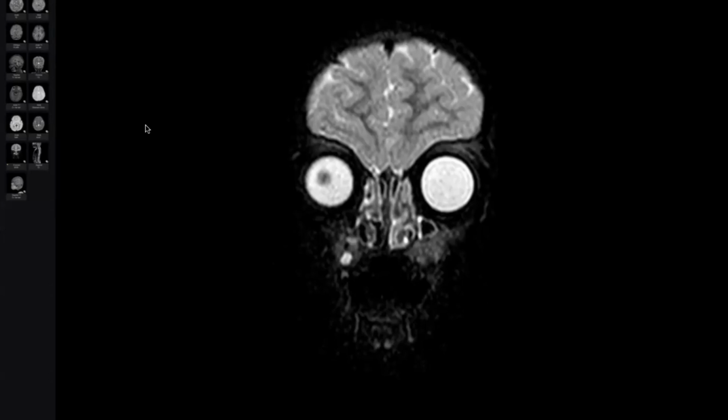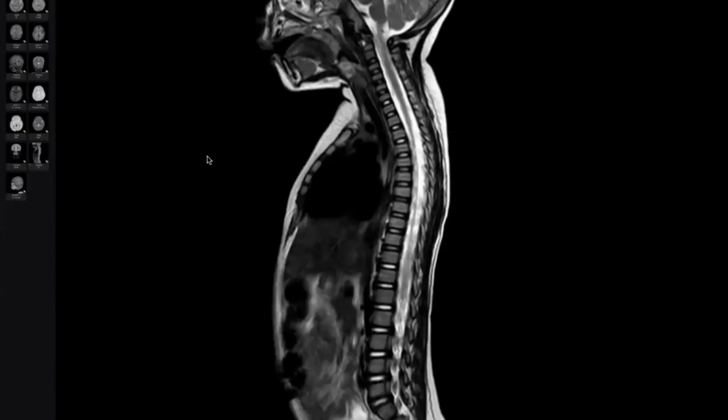Well, demyelinating, yes, diffuse demyelinating, acute disseminated encephalomyelitis. Not encephalomalacia. Myelitis. What is myelitis? What do you mean by it? Infection of the white matter, inflammation of the white matter. Okay, but myelitis itself is in the spinal cord. Yes, so we should see the cord.